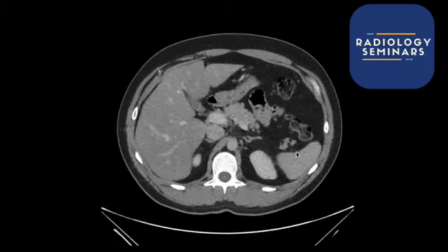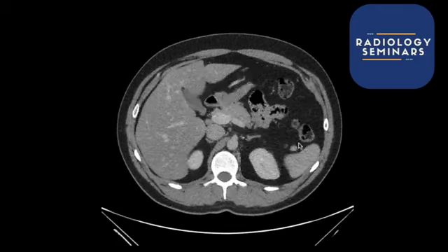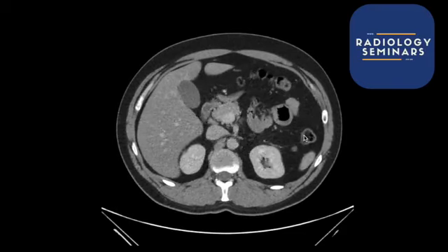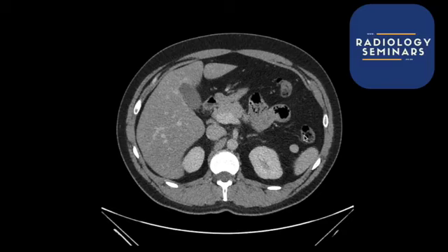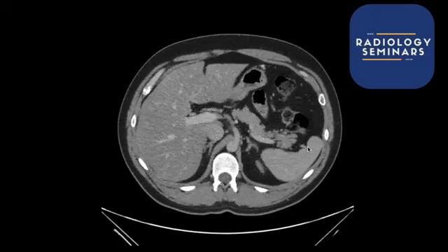And actually, when you look at the pancreas that's nearby, it's not quite the same sort of fluffy appearance. It's very, very spherical. And, in truth, it looks almost identical to the spleen. I suppose for argument's sake, you could say it looks a bit like the same density as the kidney. So some of you may have got it, and, good, great. So we can see that is a splenunculus. Right, excellent. So this is a splenunculus, and it can be a very, very normal thing to have. It's usually found in this particular region, and there's nothing to worry about.